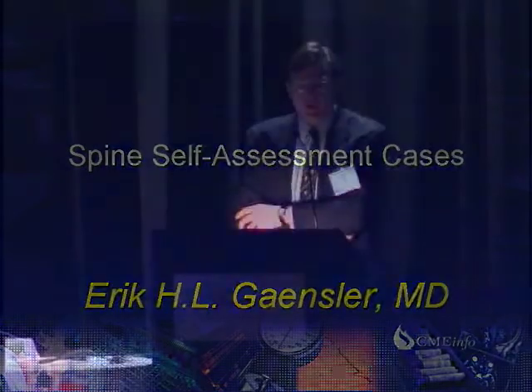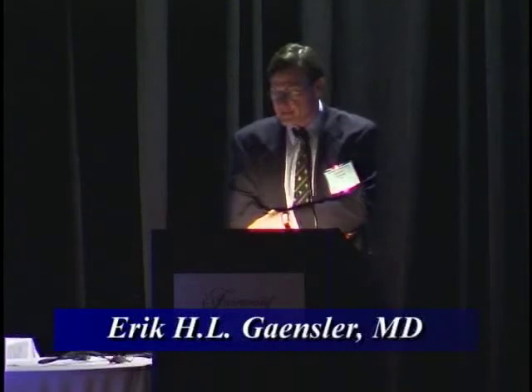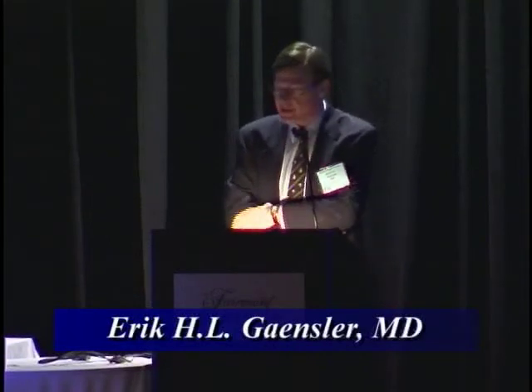We're going to have 6 cases in a row, and I think this is, if you really commit yourself on paper, most effective. And for each of these, before I say what it is, I want you to put down N, I, or O. N means neoplasm, I means infection, and O means osteoporotic insufficiency fracture.